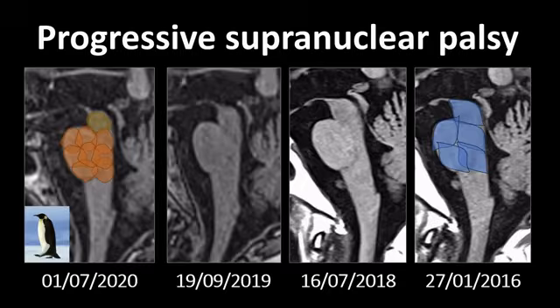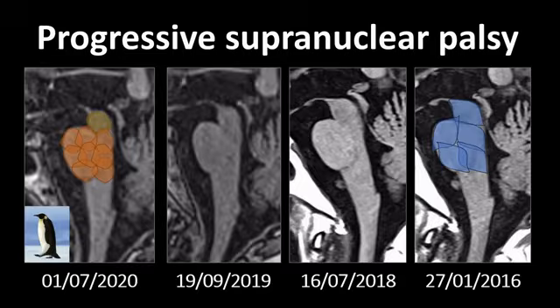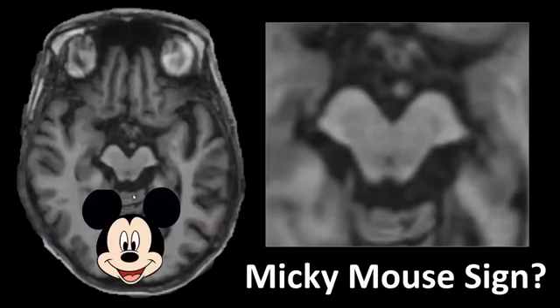It can also become atrophic in some other disorders, but not as severe as PSP. So there's a gray zone. That's also why the hummingbird or penguin sign is not so specific, and it's very subjective. So actually, I don't really use it. I always measure the ratio of the midbrain to the pons, and I rely on that.